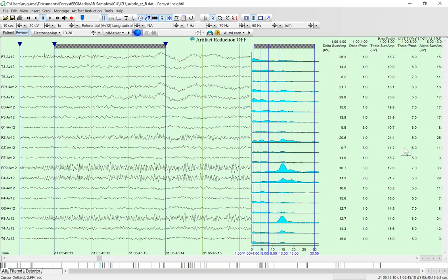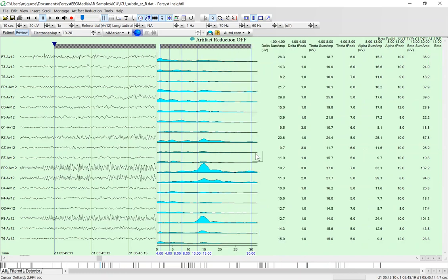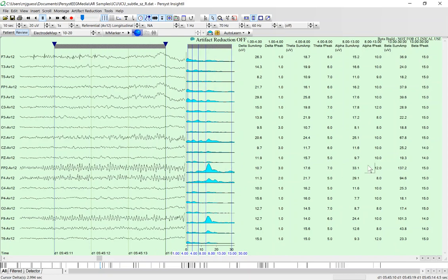And so if we look at our beta bin, we can right click, copy this to the clipboard, we'd see what frequency we have here. And this isn't fitting on the page, so I can go here. If I go to the edge of these adornments, you'll see that there's a place where it becomes a two-headed arrow. And I can shrink this down and see more of that. So I'm just going to move this a bit over to the side here so we can get more of the table on the page.